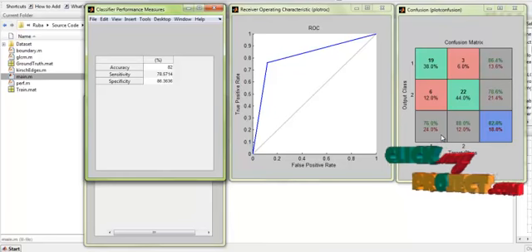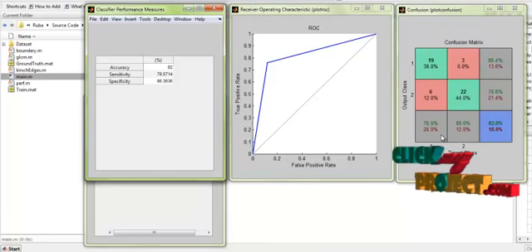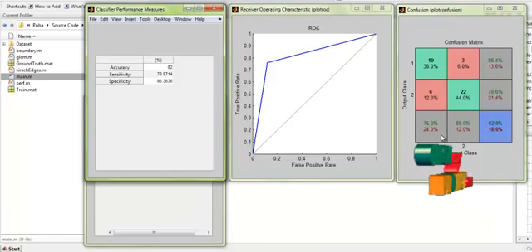Thus we are providing segmentation and classification methodologies for the detection of exudates in the retinal images, which is caused by diabetic retinopathy.